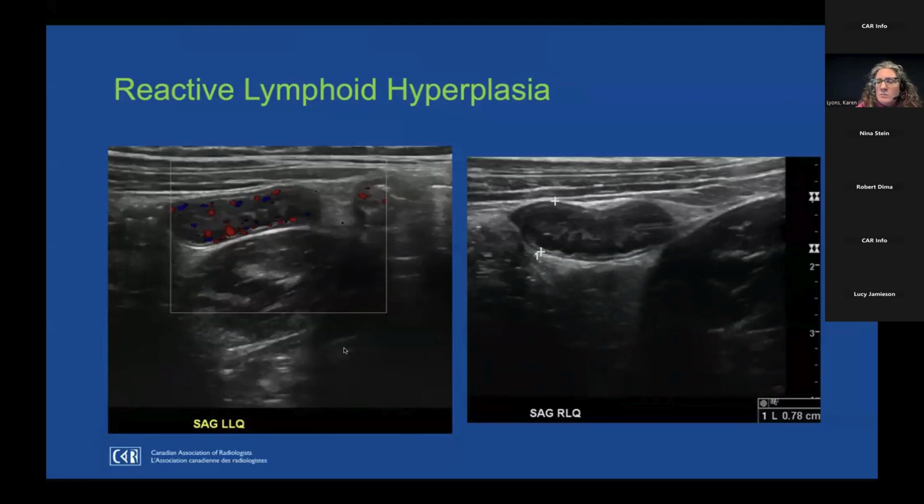This is characterized by that hypoechoic cobblestone appearance of the inner appendiceal wall on ultrasound, and then the absence of an intraluminal exudate or periappendiceal inflammatory change. The appendiceal wall is a repository of mucosal-associated lymphoid tissue, and reactive lymphoid hyperplasia is reported in association with upper respiratory tract infections and also specifically with infectious mononucleosis. And we see this, I think, more commonly in children than in adults because of the lymphoid hyperplasia.